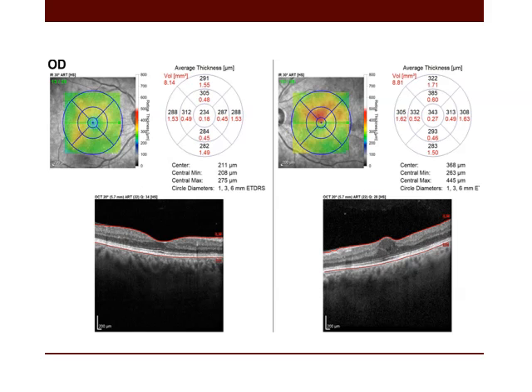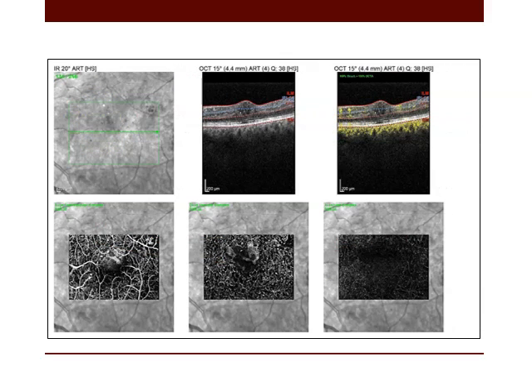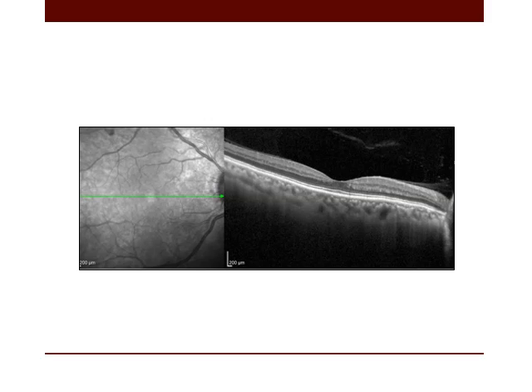Another patient with nearly dry macula in the right eye and central involving cystic thickening in the fellow eye. In the eye with central involving cystic thickening, we found that there are white hyperreflective changes corresponding to the cysts instead of the black areas. Why? Because these cysts contain moving particles, so they were detected by the device as white area instead of black.